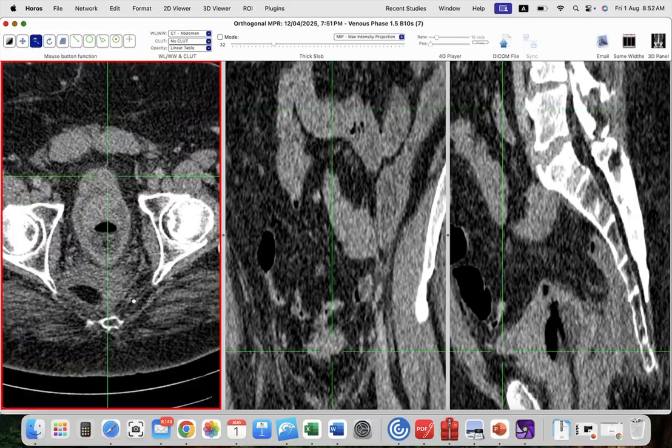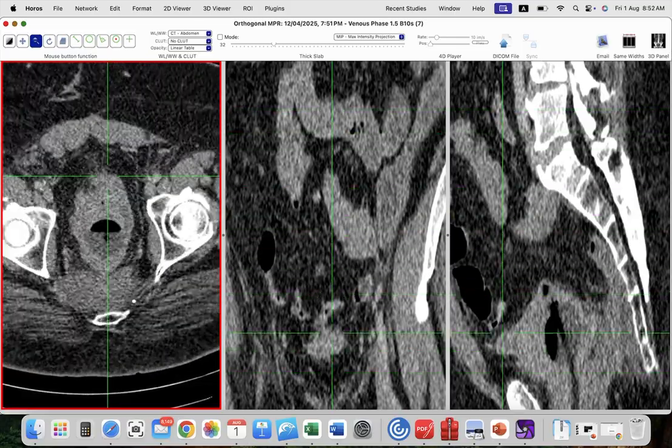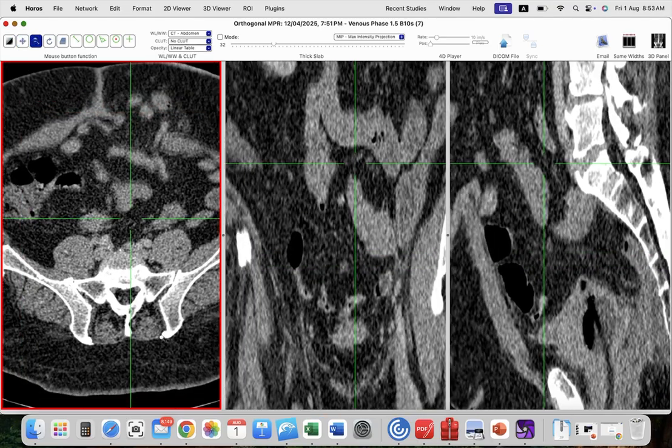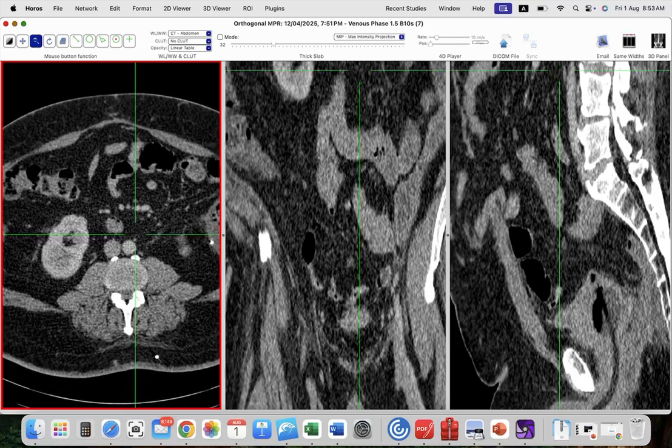Sometimes it shows a hypermetabolic state in PET studies, but it is not a metastatic lesion or a neoplastic lesion.